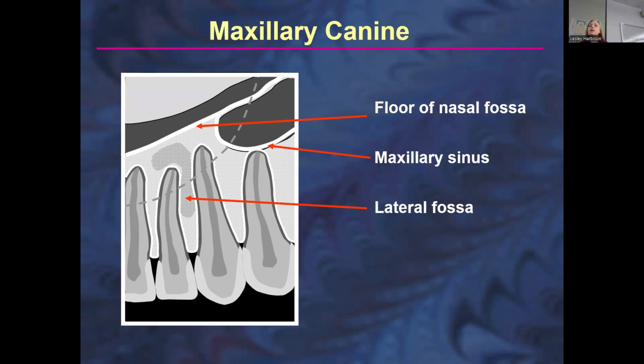Okay, this one is a little bit tricky because you have to get orientation correct. You have to know what teeth you're looking at, and sometimes it can be really hard because a canine looks more rounded like a premolar, and so it can throw you off. So orientation is super important for this one. This one is highlighting something called the inverted Y, and it's not listed here. I think it's listed later, so maybe I should wait. But let's just talk about what we do see here.